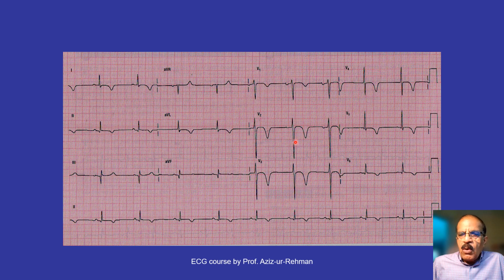So we are now going to discuss a few examples. Now this is one example. Imagine this patient with high risks, diabetes, smoking, hypertension, obesity, or something like that, presents with severe persistent chest pain which is diffuse and radiates to the jaw or the arm, and there is diaphoresis, and this is the ECG. Now when you analyze, the rhythm is stable, no arrhythmia, not even sinus arrhythmia.